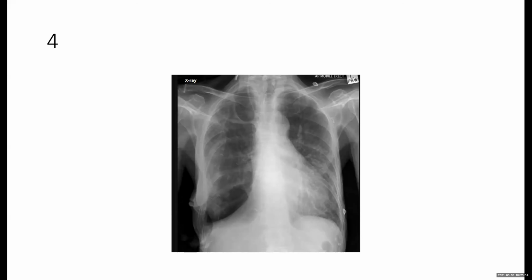So I need another lateral view. Okay, so your findings are right. There is lucency in the right lower zone that is extending to the chest wall, and also there is a central line. Okay. So apart from that, do you see any other prominent findings?